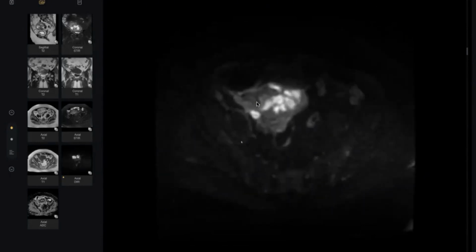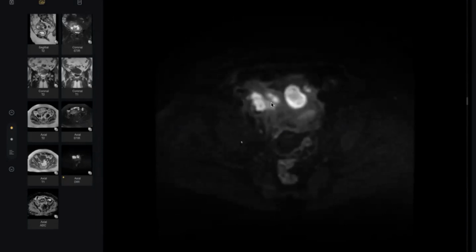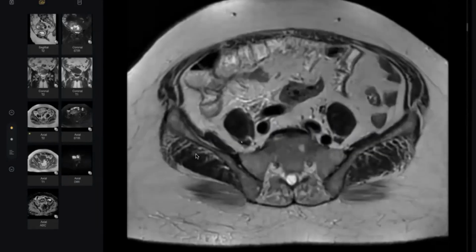Okay. Finally, what's your diagnosis? Perforated appendix with phlegmon formation. With abscess formation, not phlegmon. Is this phlegmon or abscess? Sir, it shows restricted diffusion, then this is an abscess. And there is surrounding fat stranding also present.